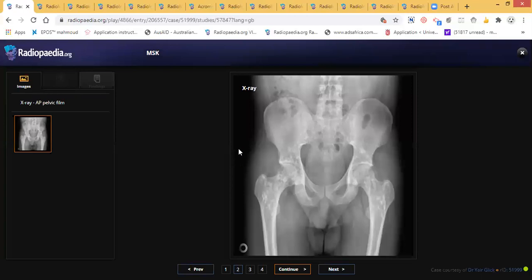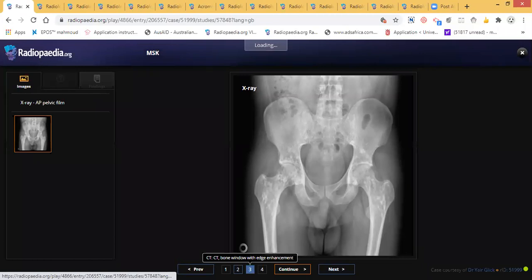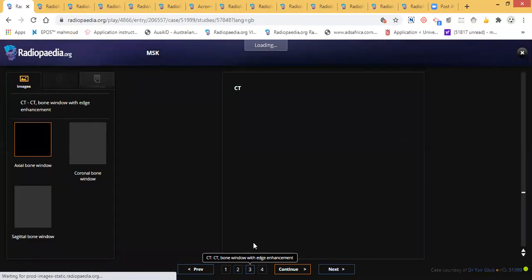This is one of the anatomy cases, but it is tricky because the other differentials with this case are very dangerous. Either metastasis or osteopoikilosis. Yes, osteopoikilosis, one of the good differentials to put. Look in the CT.